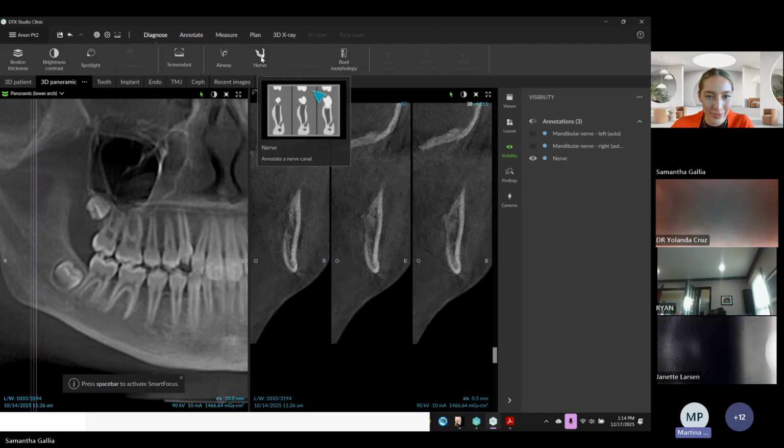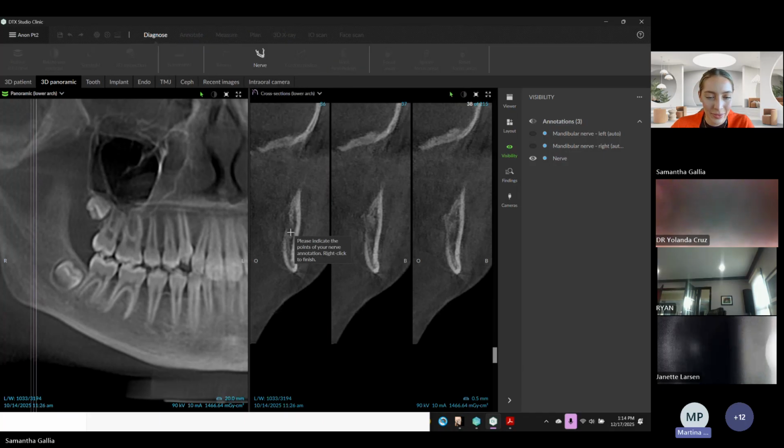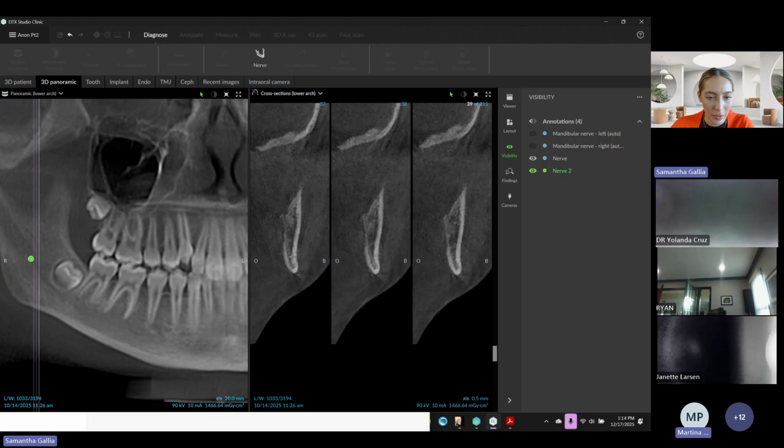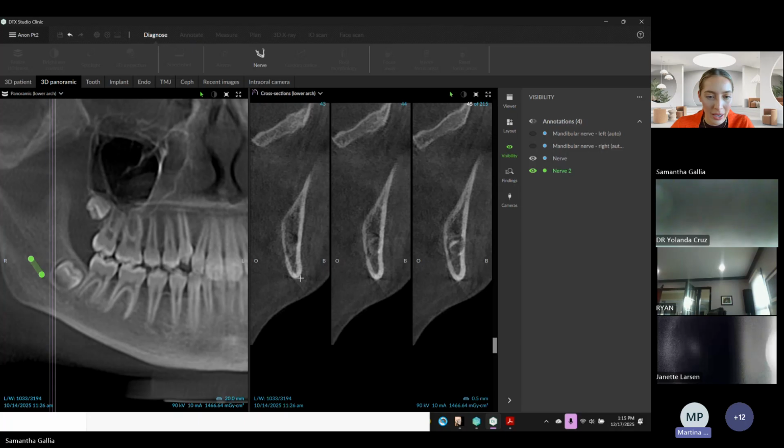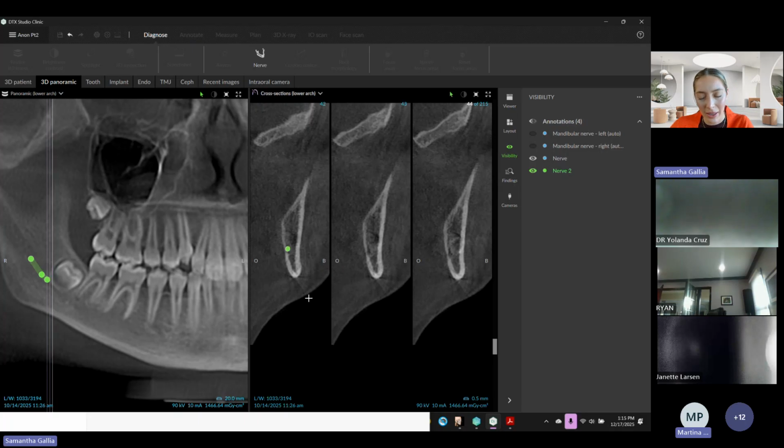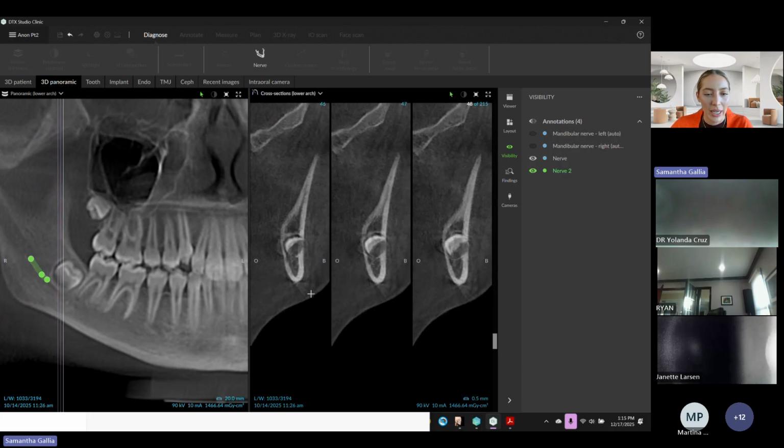Just for the rest of the group, somebody had asked about when you're orienting, do you put the occlusal plane flat in the AP direction? And I put a comment in there about the Frankfurt plane and gave them a picture for that, as well as the hard palate if it's a smaller field of view. Yep, that's exactly what I do too. Frankfurt plane is the more ideal. That's what we would do if we had a large field of view, but if you have a smaller field of view, hard palate is a good rule of thumb.